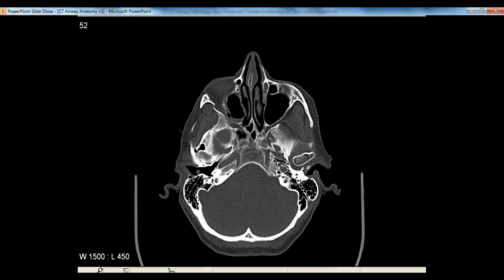You can see now the nose is beginning to extend out just as soft tissue. We're getting below the level of the bony nose. You can see the septum, the central area, is becoming more clear. And now, in the black areas of the nasopharynx, you're also starting to see these gray structures, and those are turbinates. And turbinates basically are mucous membrane covered cartilaginous structures that protrude out into the nasopharynx, and their job is to basically be sticky mucous membrane surfaces to catch debris, to act as filters basically.